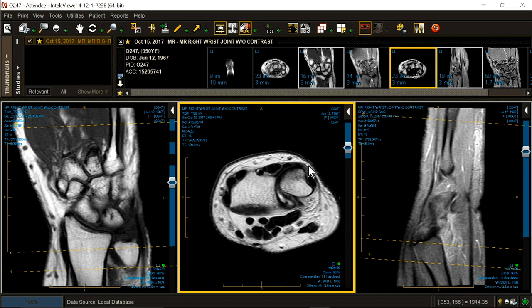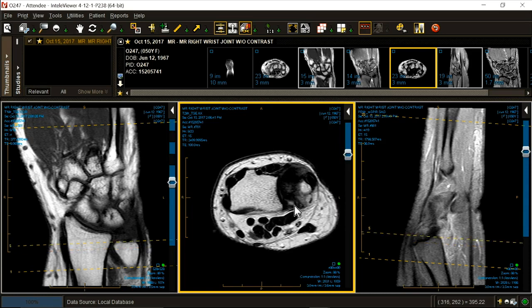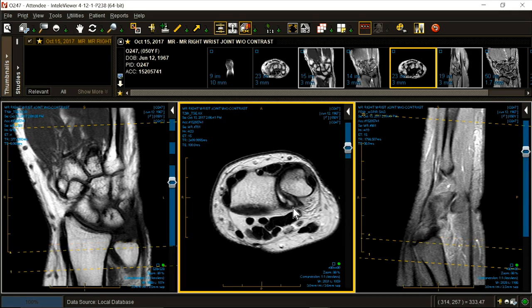You'll see it later, but that's no matter. We compared the two sides, and there was much more excursion in the right wrist than the left. Now, why does this happen? We see it more frequently in negative variants, and look at the volar radioulnar ligament. Look at how thick and fat and fibrotic it is from chronic injury.